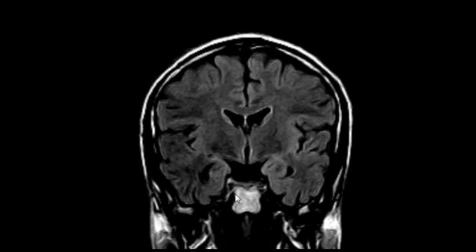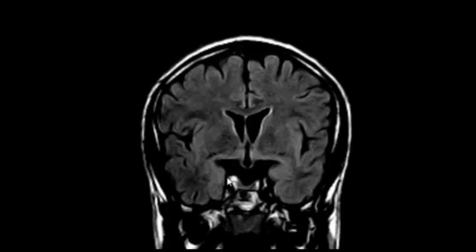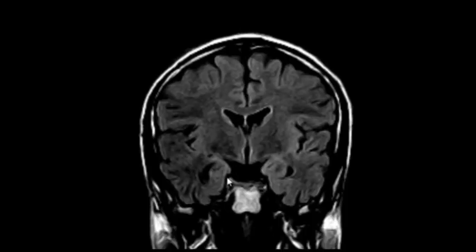Second, normally the temporal horn is slit-like, especially in young people. In older people with brain atrophy, you might see it a little bit prominent, but it should be symmetrical. If it's asymmetrical... normally it should be slit-like. Slit means line, just a line, okay? Is this slit-like? No. Is this slit-like? No. So both of them are atrophied. However, it's more prominent on the right side, okay?